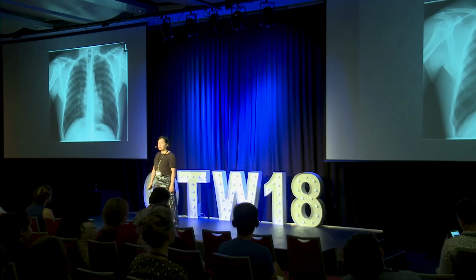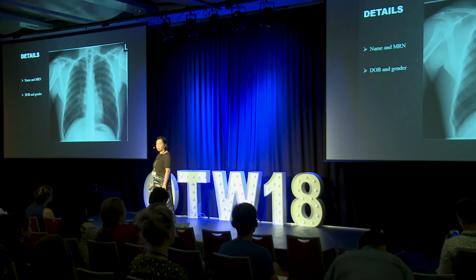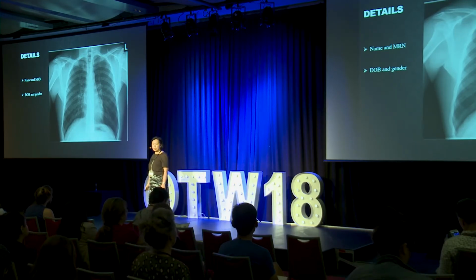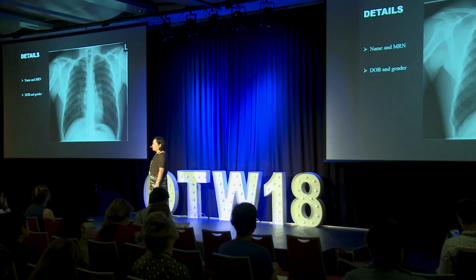So what I would do is first check the details. Make sure that you are looking at the right patient, checking the MRN, because patients can share similar names with very similar spelling. So you check the date of birth, the MRN, and the gender of the patient.